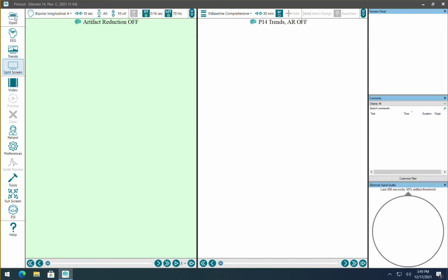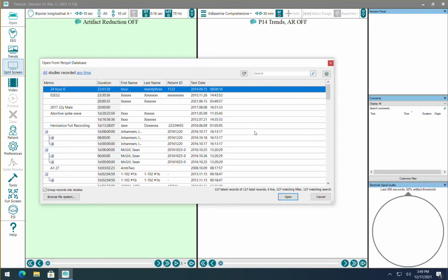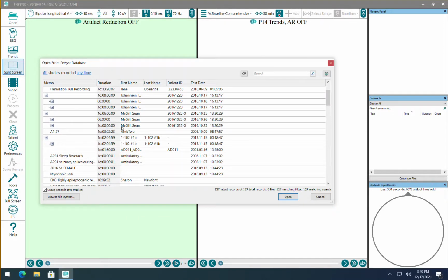In this case, let's go ahead and return to our discussion of back averaging, which is typically done when you're looking at myoclonic jerks to help average out, or to attempt to average out, muscle and movement artifact. Some recordings are more amenable to that than others. But the important thing is going to be placing the marks for that averaging very carefully and consistently, because if they're not precisely placed, if they're a little early or a little late, then you end up averaging out the cerebral signal and artifact. And so the placement is going to be the key thing.